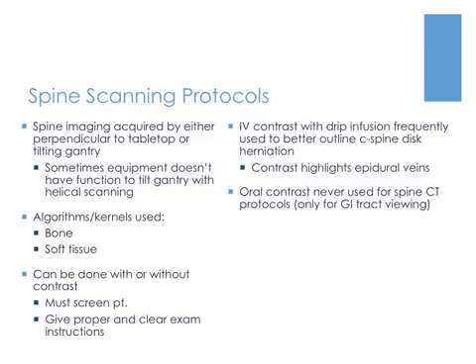Cervical disc herniation is usually more difficult to diagnose than, say, an L-spine herniation due to its curved outline and the smaller size of the cervical region as compared to the lumbar. IV contrast is used frequently to better outline a cervical disc herniation since it highlights the epidural veins in the cervical region, and this is done with the drip infusion method.